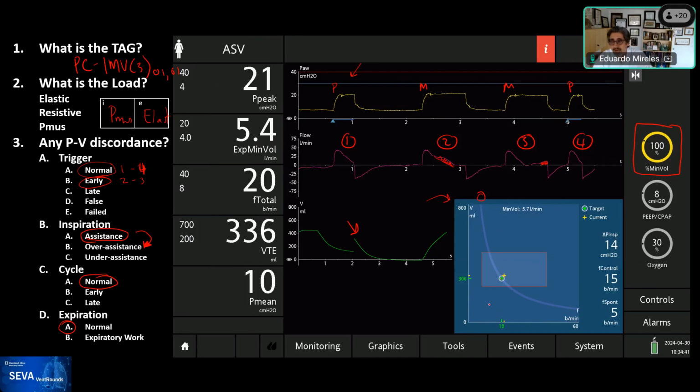Rob, is that correct? Yes, just to point out though, the curve is all the points, or all the combinations of tidal volume and frequency that will meet the predicted minute ventilation. They're all equal minute ventilations. But the one point is the optimum tidal volume and frequency based on the equation to minimize power.